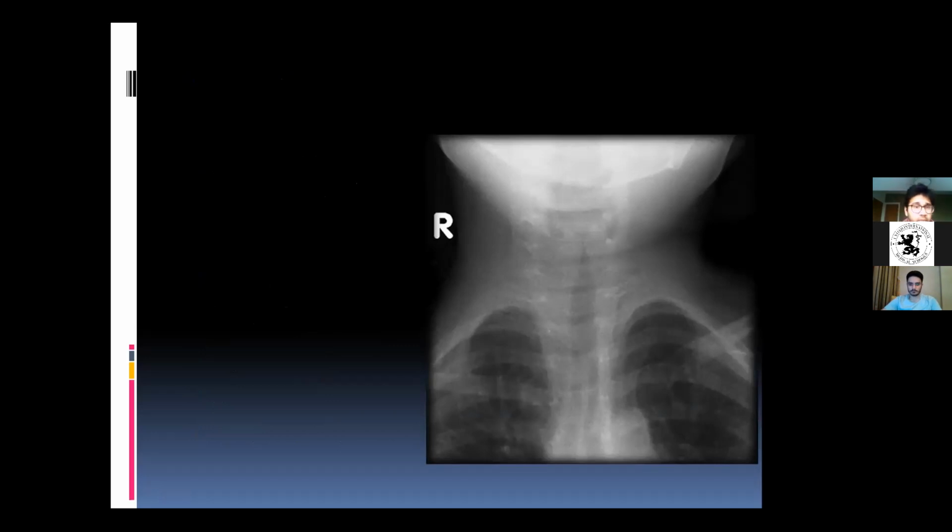Again, you can just unmute yourself, or you can just type in chat. Exactly. Not a narrow larynx. Larynx is more above this. Not tracheomalacia. I think we already had the right answer by Moina. It is a steeple sign. Okay. Now the steeple sign. Does anyone know what the steeple sign corresponds to?